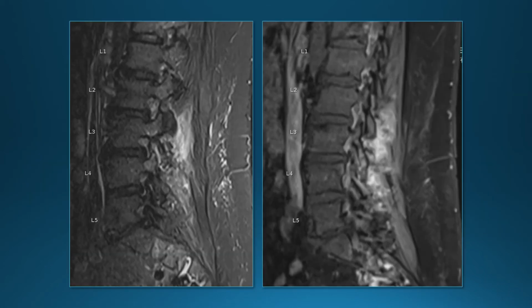Looking back at the sagittal images, as we said, the discs looked fine here. We didn't see anything in the disc, nothing in the prevertebral soft tissues, but in the posterior soft tissues, there was abnormal signal in the facet joint, and especially in the soft tissues posterior to the facet joint, abnormal STIR signal, abnormal enhancement. So this was a case that started as a facet septic arthritis and subsequently developed an epidural abscess. So occasionally epidural abscess can start as a septic facet arthritis.